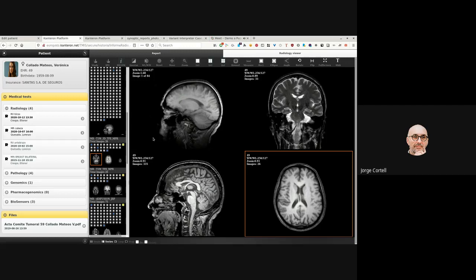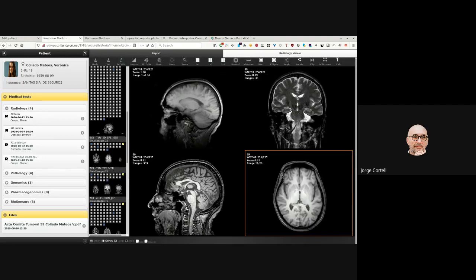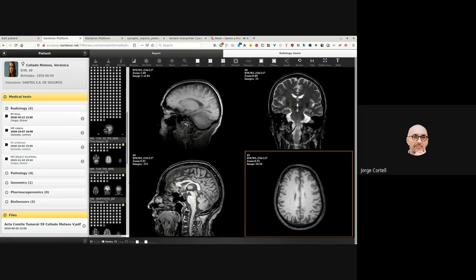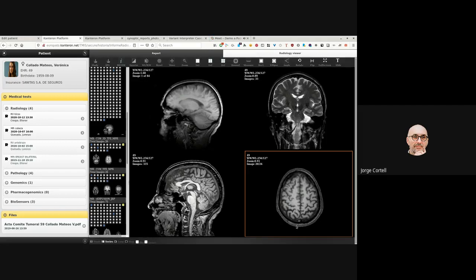So what studies are shown is determined in the administration and the configuration. But anyways, we have the studies there and we review. So we've seen in the report, okay, I'm going to play doctor. I'm not a doctor, so I'm just going to make up stuff. Let's say I'm an oncologist, and we've seen in the report that they say there's a tumor. I say, oh yeah, I see there's a tumor here.